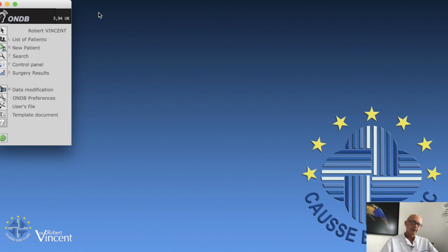The next step will be to demonstrate in more detail how to use what I call the pop-up, which means how to develop the program to use it for other subspecialties of otolaryngology, which means rhinology, head and neck, etc. And of course, as you will see, you will have to make the possibility not to use audiometry for those pathologies.